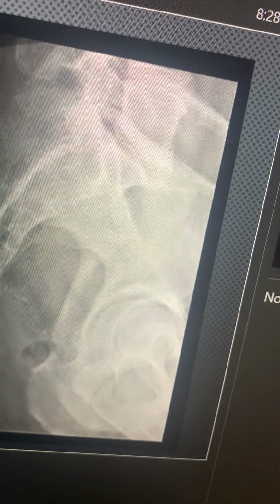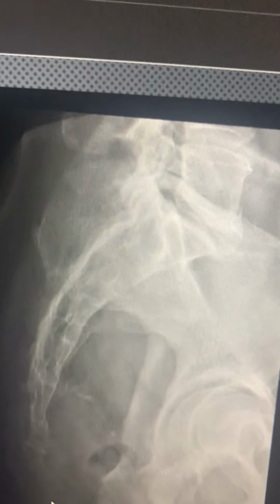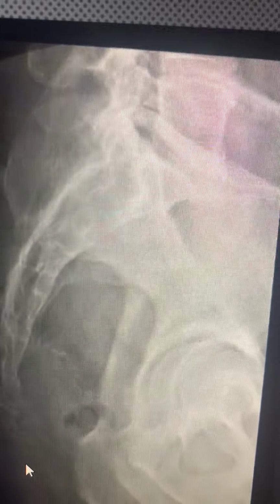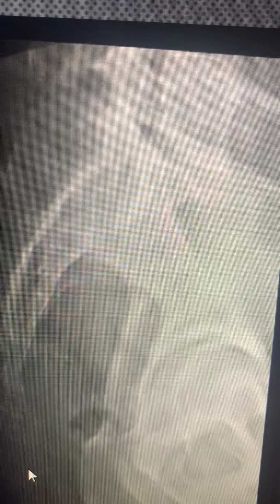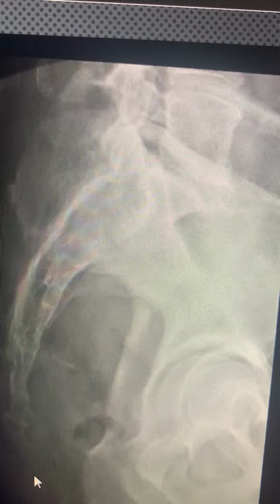Nothing superimposed here, and this would meet good criteria, and since we have enough density to see all our bony margins and good contrast, we can visualize stool findings here and bony margins. And we have sharp bony margins because I did tell the patient to suspend their breath. So we have crisp, clear images, so no repeats were necessary due to the technique or patient positioning. And that looks like it is all.